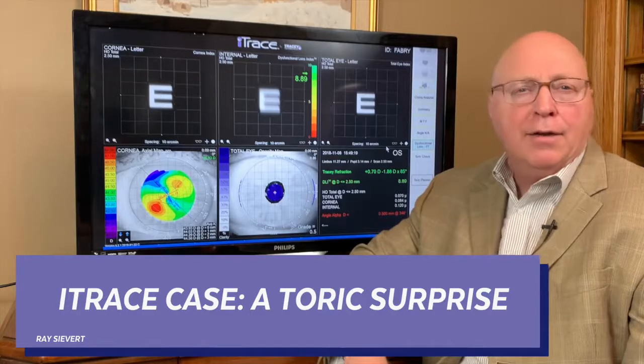Today we're going to take a look at a toric surprise and try to walk through a case presentation of how this problem happened and how to fix it. So let's take a look.